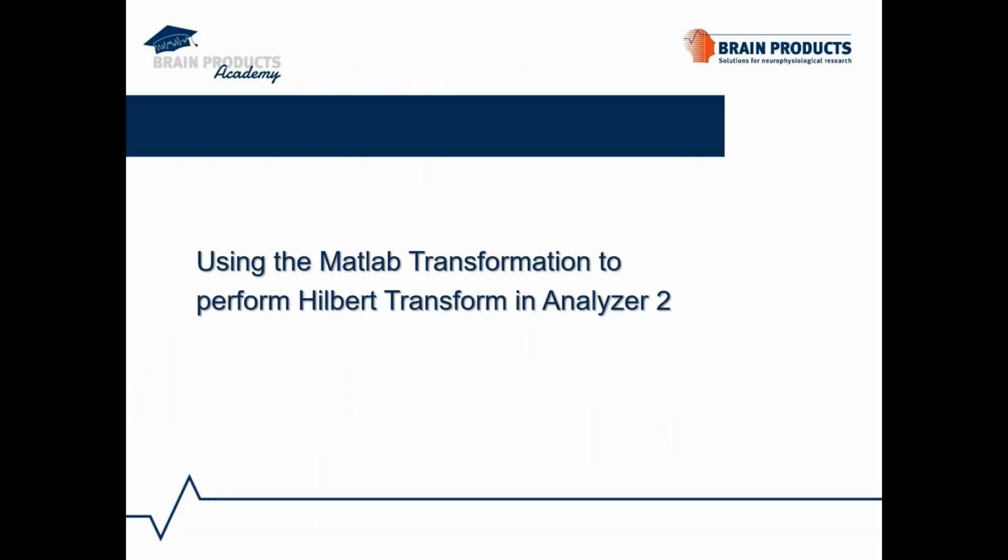Now, I will show you how to use the MATLAB transformation to perform Hilbert transform. The MATLAB transformation is designed as a bridge between Analyzer and MATLAB. That means you can transfer data to MATLAB, perform further analysis in MATLAB, either using built-in functions or custom MATLAB scripts, and then re-import the data to keep working in Analyzer. Now let's go to Analyzer.